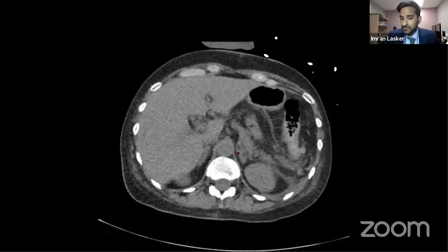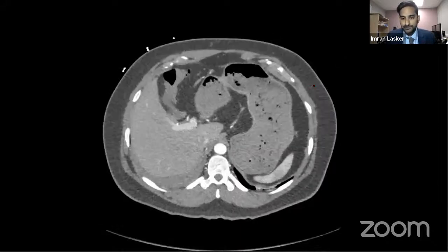The truth is there is no contrast. This is the aorta that's sitting over here. It doesn't look any different from the liver. It doesn't look any different from the kidneys. Now have a look at the bone. That's high density. That's hyperdense because it's bone. Calcium is dense. But in this particular study, we don't have any evidence of any contrast anywhere.